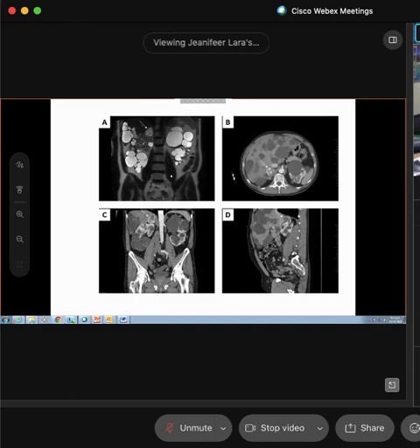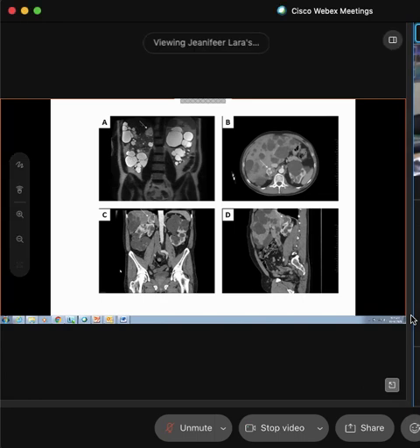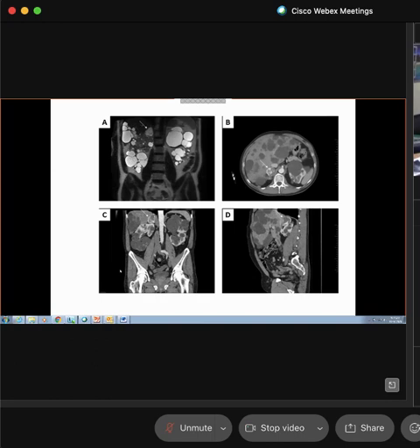So we are able to see the lumbar vertebrae more clearly because of that lordotic curve, the vertebral bodies are positioned more anteriorly as opposed to the thoracic. Good. I want to go ahead and go down to C first. What kind of projection is C? Axial, sagittal, or coronal?